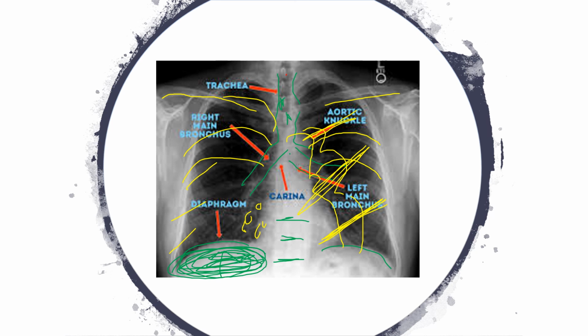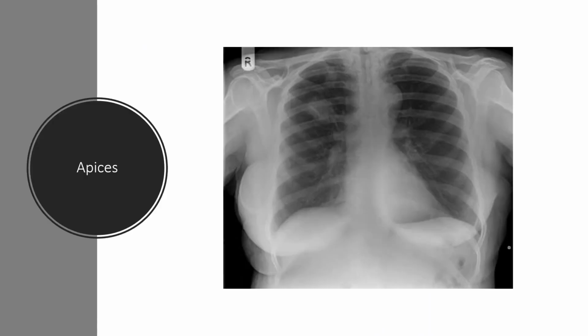If you're looking at the chest cavity or the rib cage itself, they curve up posteriorly, and they curve down anteriorly. So these are curved up like a McDonald's arch. So those are posterior ribs that you're looking at there.